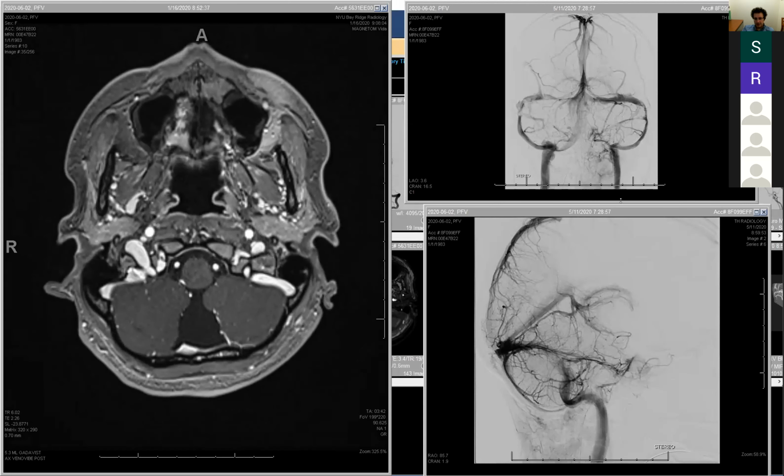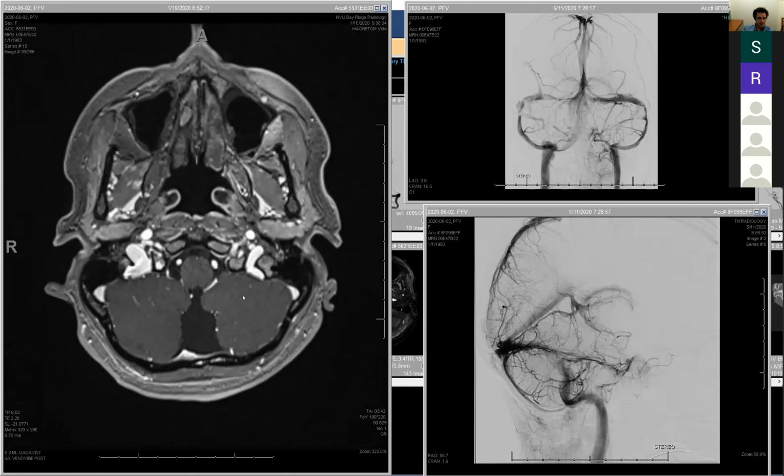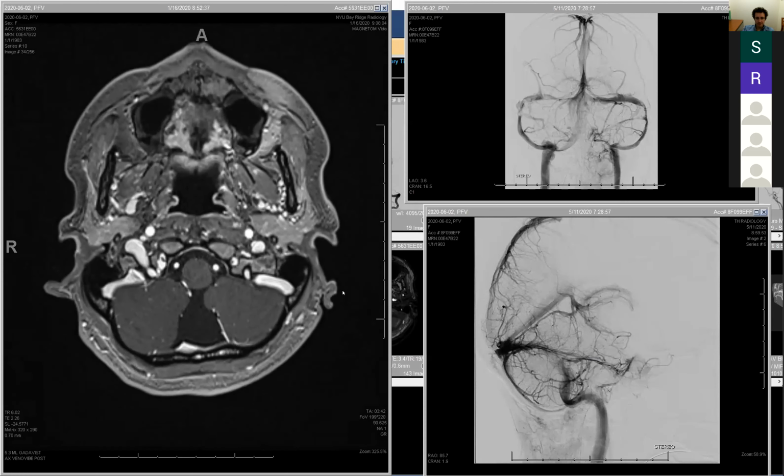In general, the features here: this is the superior vermian vein, what's called the superior cerebellar vein, because it's continuous with the lateral mesencephalic vein. There's the precentral cerebellar vein and inferior cerebellar veins. These are like the petrosal group here. Mainly I wanted to show this so you could see the occipital sinus.